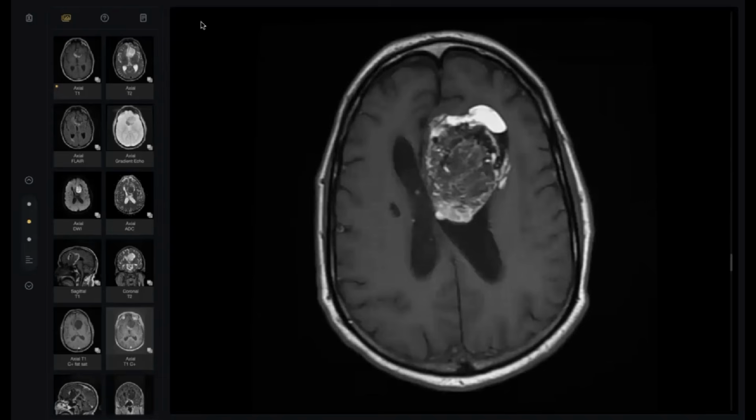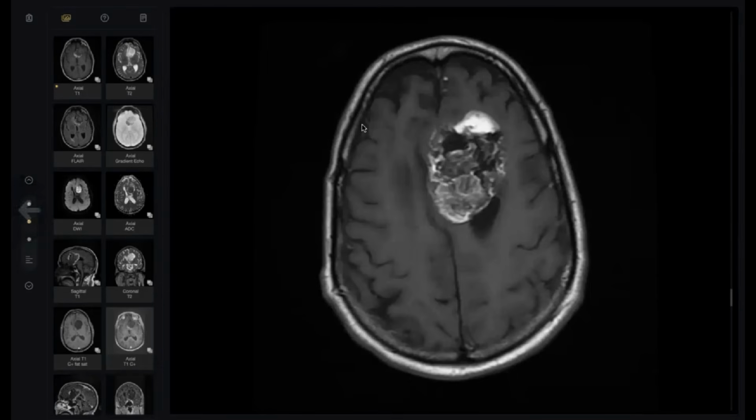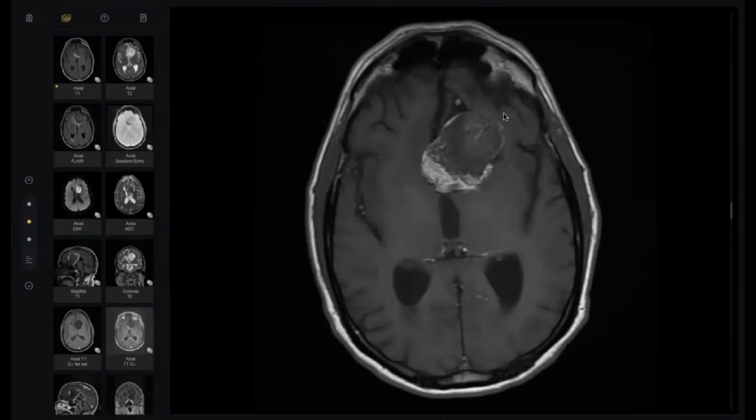I think this could be dermoid lesion. Okay. No, no, leave them. This is a fat containing lesion. What else? What happens for this lesion?